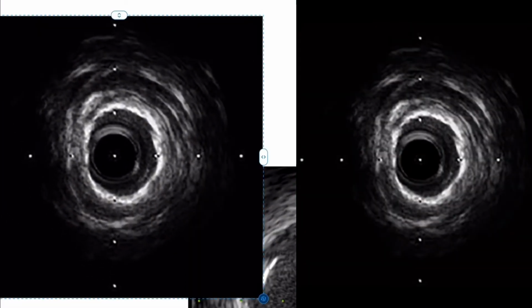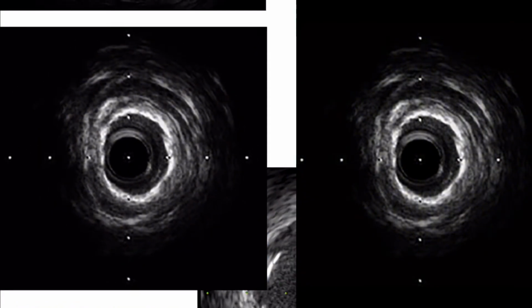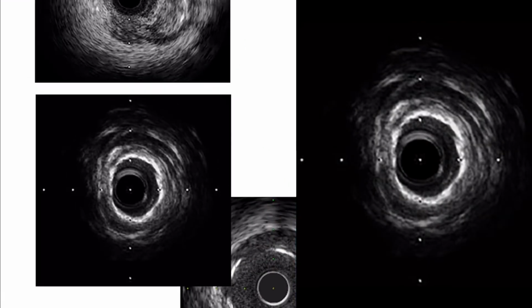This one is an interesting one that no one really wants to see, but if you notice, it's very dark, right? Very dark image compared to the image up here.